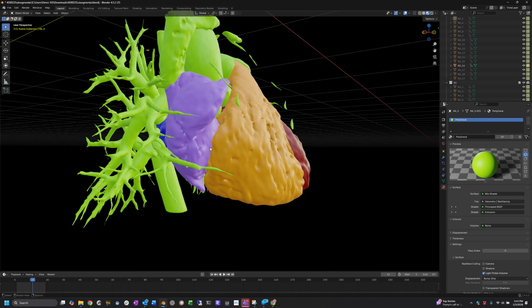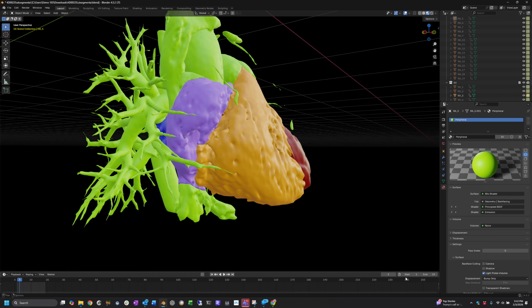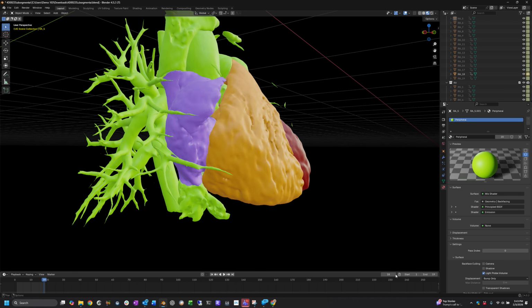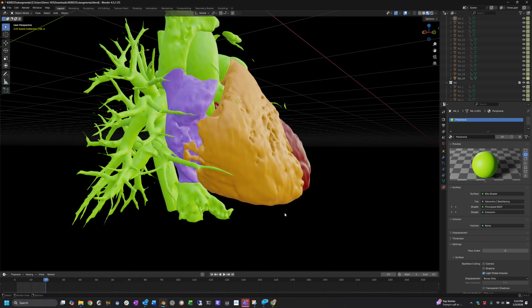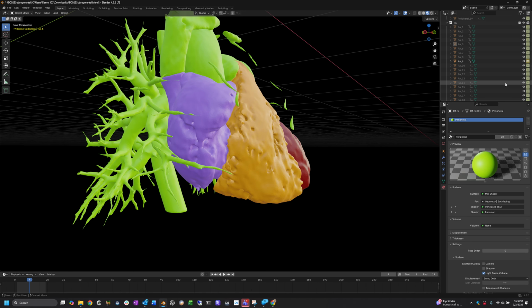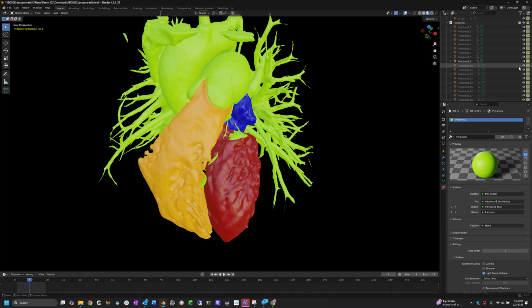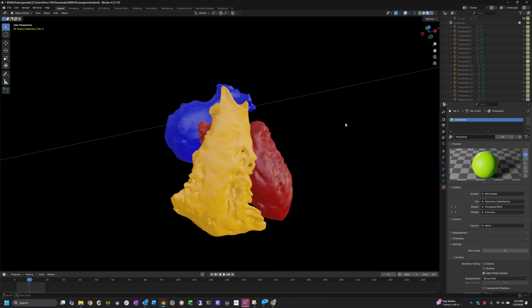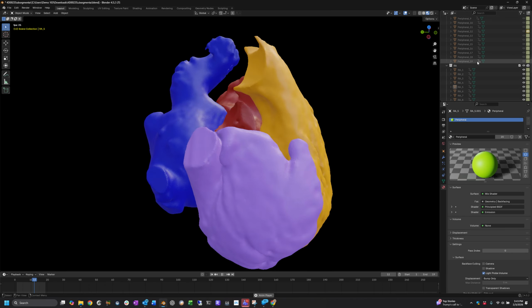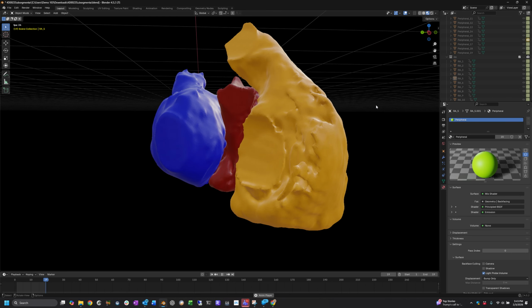As I'm playing through this, let's look at the right atrial, right ventricular border here. I think what we learned on the LV border, we should apply here also. I think it looks pretty darn good. There may be opportunity there, but in fact, let's just get rid of the blood pool. So press play. There. Yeah, I think that's fairly consistent.